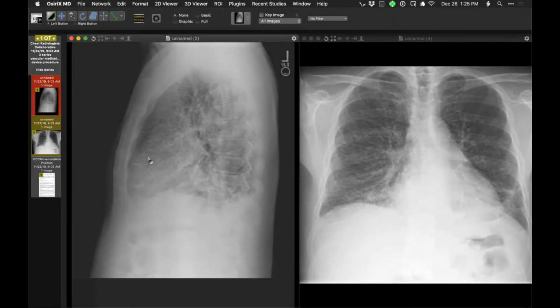But it brings up a point of the obsession with the cavoatrial junction, how it's a moving target because arm position changes constantly from radiograph to radiograph, but also just during the day with these patients, and many of them still do things. So I think as long as it's roughly in the right place, it's probably okay. It's just with your arms down, you don't want it too low because they're soft and body temperature, and they flop around a little bit. So as long as it's not too low, I think anywhere in the SVC is typically okay.